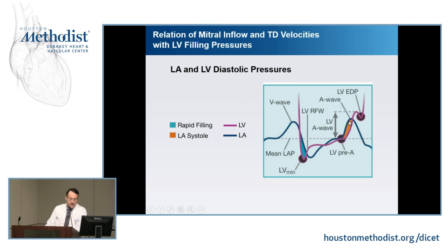To get these nice clear signals, you usually need a catheter in the LA. However, some pulmonary venous wedge pressure recordings can also be decent and show you these. What pressures can we measure aside from the V and the A waves? You can measure a mean LA pressure.